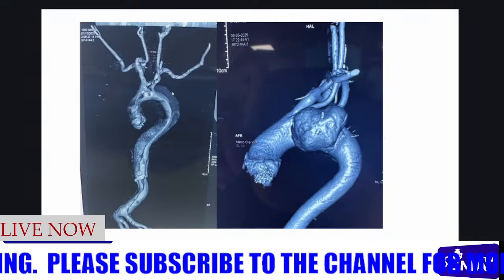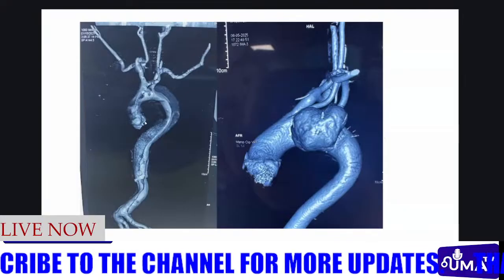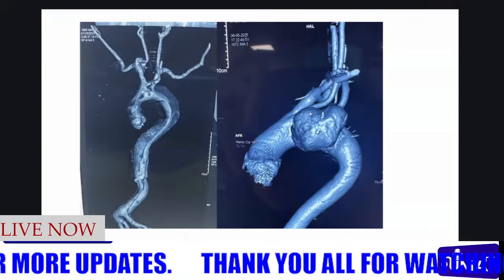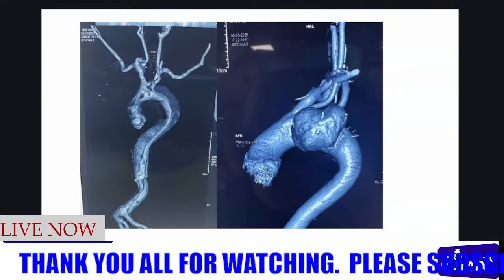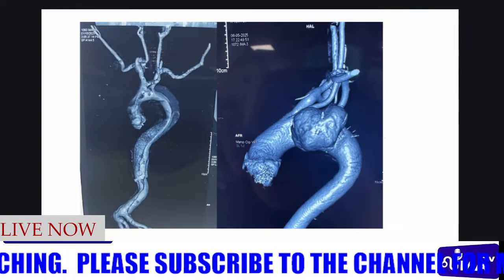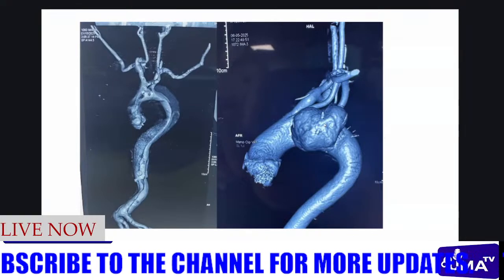The majority of the rest is false lumen, but it was a Stanford A extending up to the femoral arteries. This was a different patient, an Indian patient, who had a contained rupture at the arch. So this was a pseudoaneurysm, at the aortic arch.